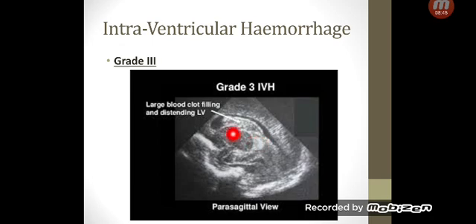You can appreciate that it's not like a fluid spilling everywhere, so it's a bit confined from here. But again, this one is covering more than the usual 50% of the ventricle, but because the ventricle is dilated, you'd think that it's a bit tricky to say 50%, but I want you to always appreciate the real ventricle. It shouldn't be that dilated.